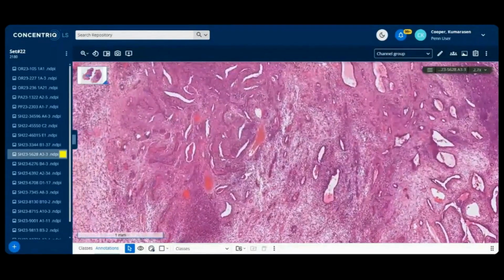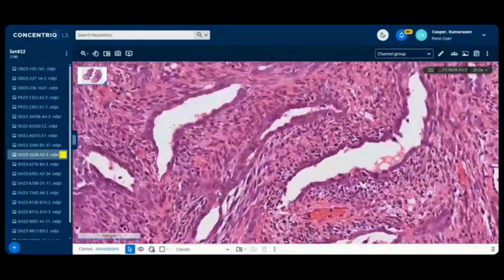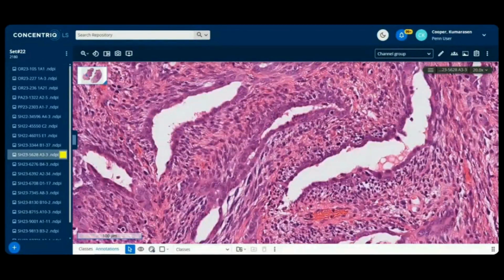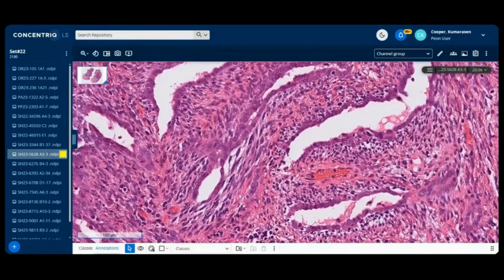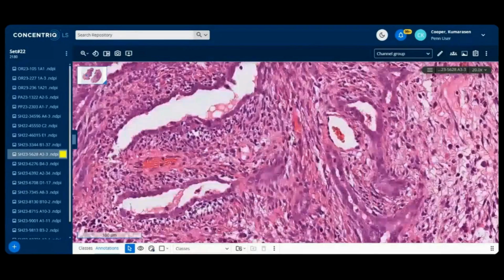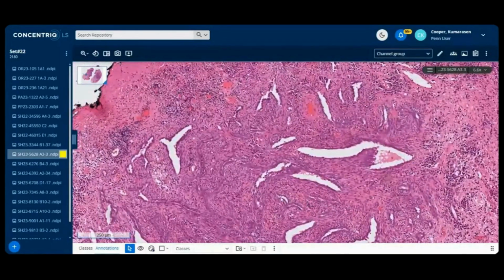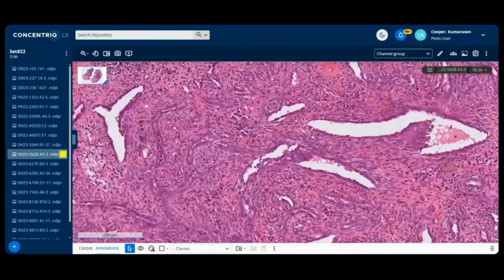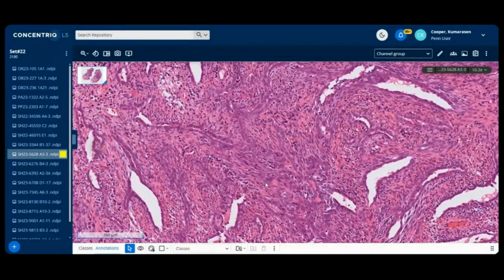And then I just want to go back to these areas that I promised you I would go to show you. You can see some of those epithelioid areas forming literally gland-like structures. Here are the spindle cells, pointy tips, very little cytoplasm, a lot of overlapping nuclei, and hyperchromatic. Now, this is the oropharynx. It's a tonsil, and I would imagine that the morphology is somewhat unusual, but let's hear and see what you think.